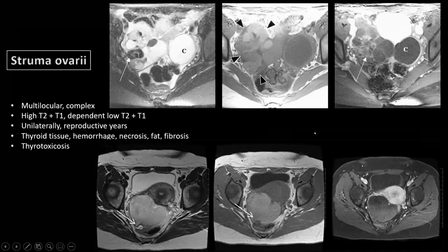Okay, moving on to other differential diagnosis. Regarding the internal hemorrhagic component or leveling that we saw in our case, this lesion is similar in the form of a complex heterogeneous lesion with internal solid component that is of low T2 signal intensity and also leveling in the T2 and T1 weighted images.